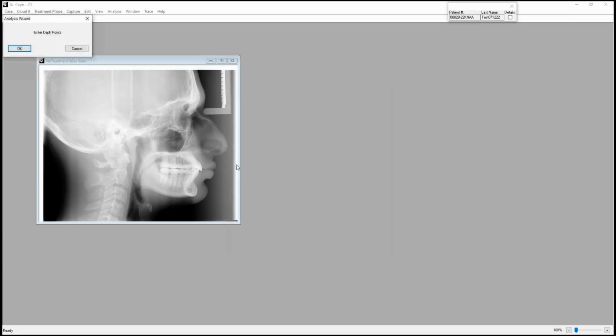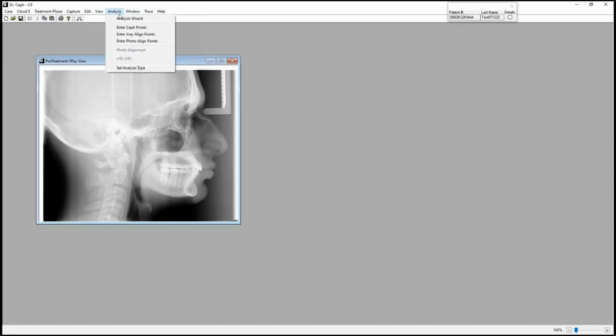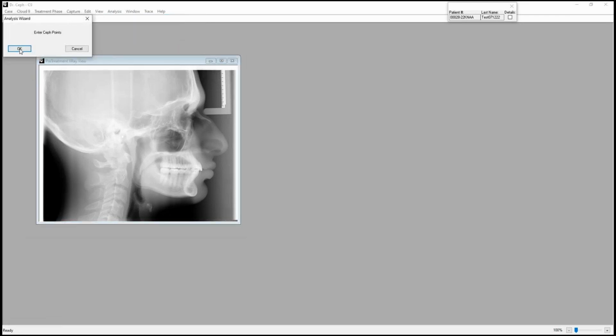I'm just going to grab my test case at the top. And then I will start the analysis wizard. If you ever happen to cancel the analysis wizard, you can always get back to it under the top line menu, analysis wizard. So to start it, we'll just say OK.